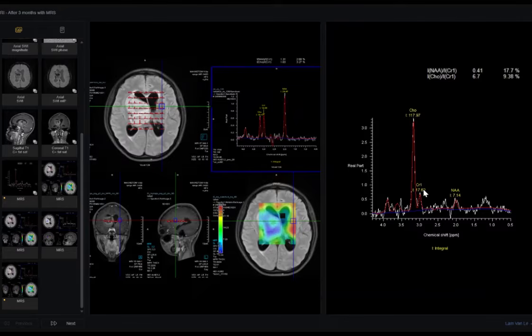And creatine, what does it indicate? It indicates the normal biochemistry or metabolite of the cell. The normal is decreased in any aggressive lesion, and the abnormal is increased. Is it clear?